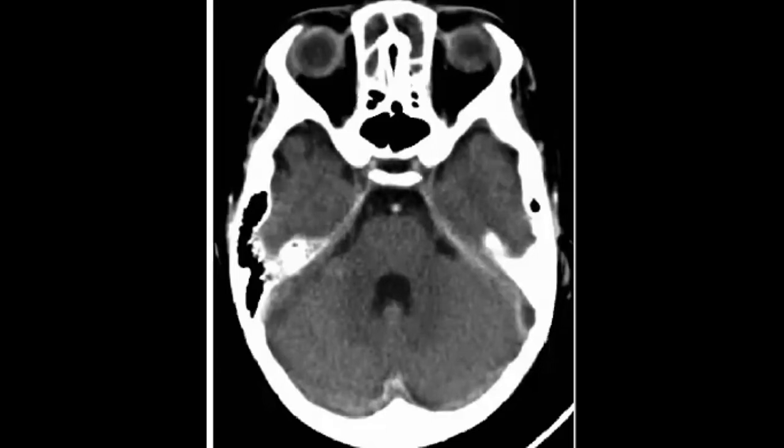I am waiting for our stars to give the best description. So Nermeen, the first one, okay, nice. So it will be like a hypodensity here. Do you want to add something in your description? Filling defect, okay, nice.